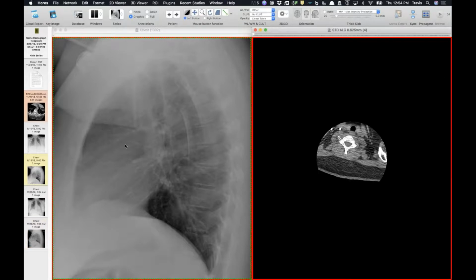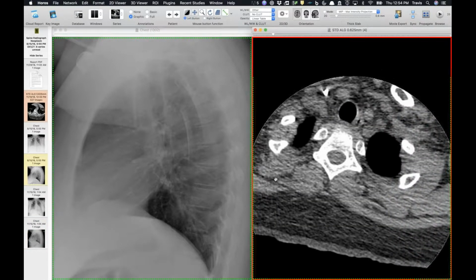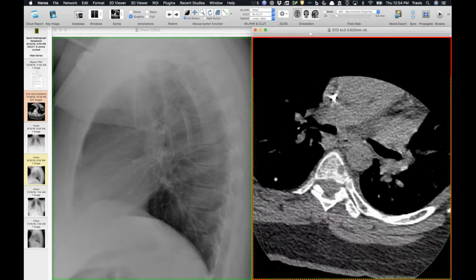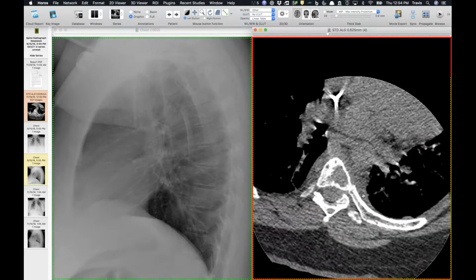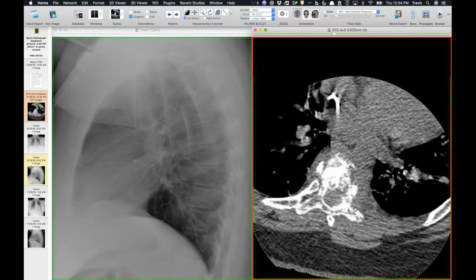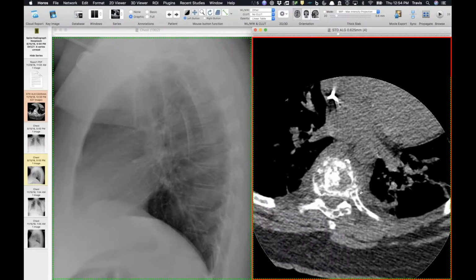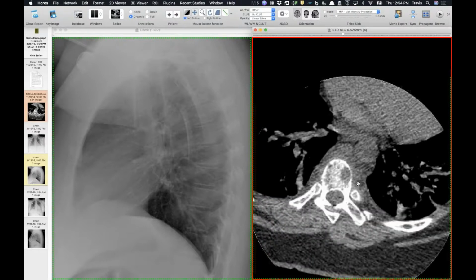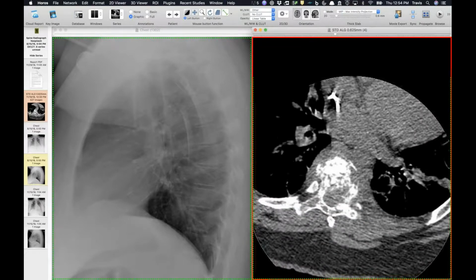So this patient, not surprisingly, came in with neurologic symptoms, and I'll just show quickly on the CT what you're seeing, that widening of the paraspinal interface there. And this was just a new pathologic fracture from metastatic breast cancer, subsequently confirmed when they did a spinal stabilization surgery. So just always a good reminder to look at the spine on the lateral view.